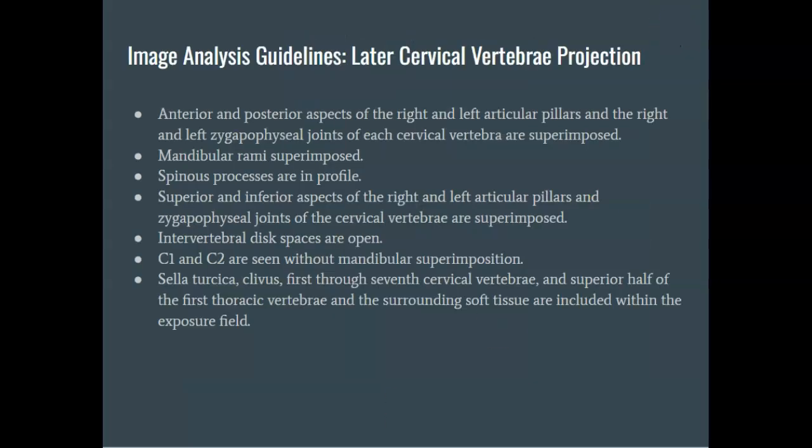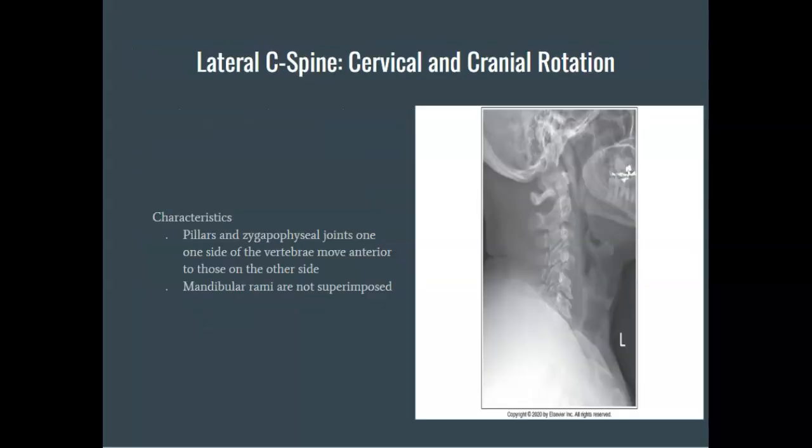You'll see the image analysis guidelines clearly stated here for your review. So now let's look at some positioning errors.